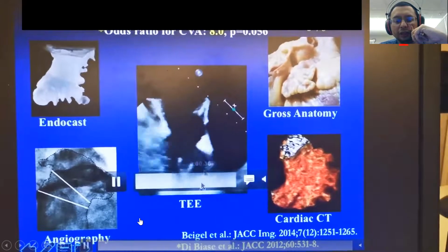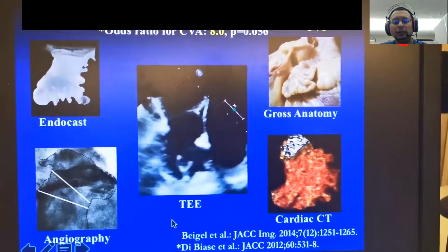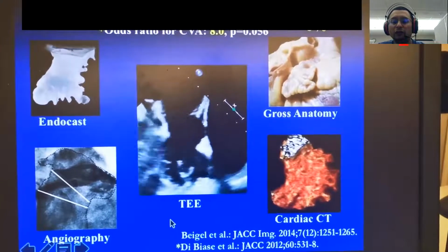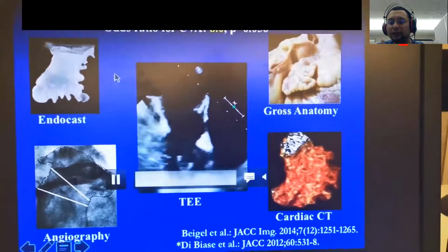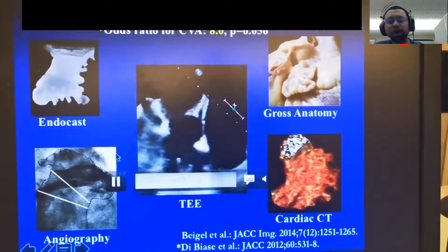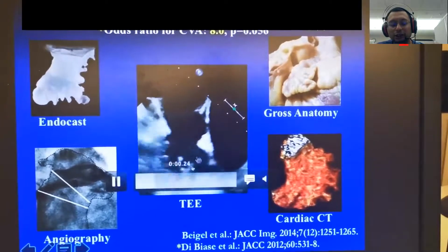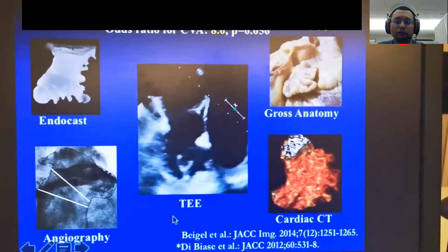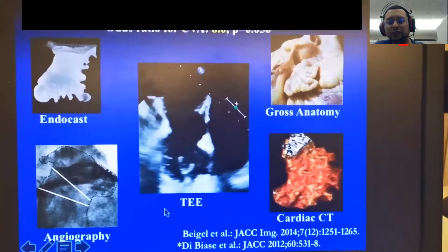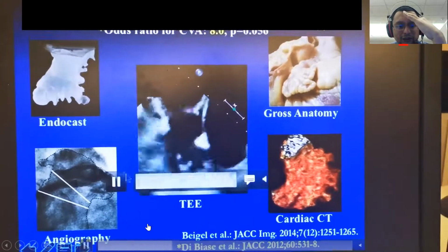The 4 different types of left atrial appendage are quite difficult to tell apart. I also struggle, but just for you to remember, there are 4 types and it is actually like food. So chicken wing, cauliflower or broccoli, cactus, and also windsock. The only thing I think is important to remember is whether it is chicken wing or non-chicken wing. The reason being that non-chicken wings have a much higher risk of developing stroke compared to chicken wings. But this is how it looks. I don't know whether you can remember or not.